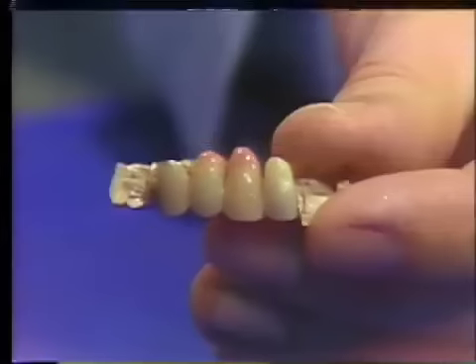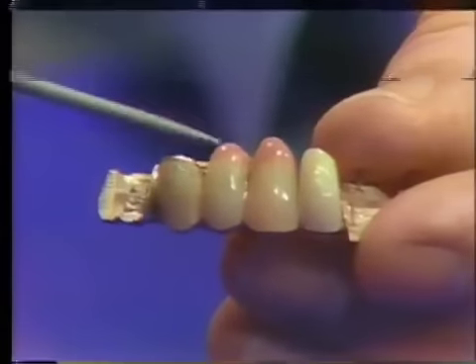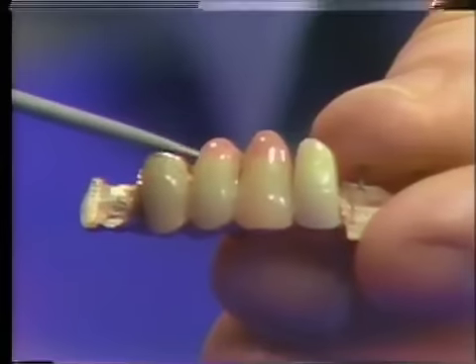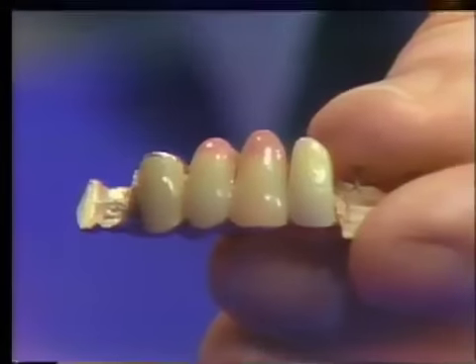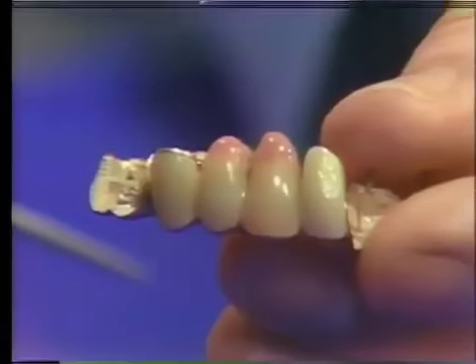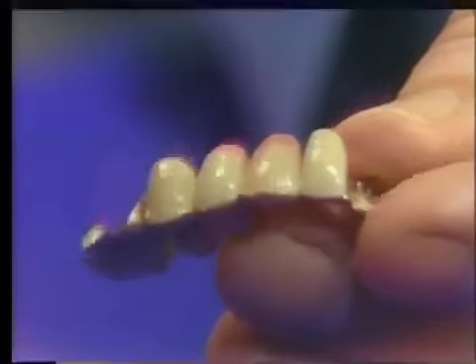This is for an older patient who had some rather severe gingival recession, and you can see that there is a little pink coloration at the top here. It's sometimes done in the long Pontic facing of this nature to place a little pink porcelain which is fused on at the top end here in order that this part of the Pontic blends in with the gingival tissue and gets lost. In the mouth, that looks a little pinker than it does on this TV screen, and there is a fairly definite boundary between the pink and the porcelain. So it tends to reduce the overall length of that particular Pontic.